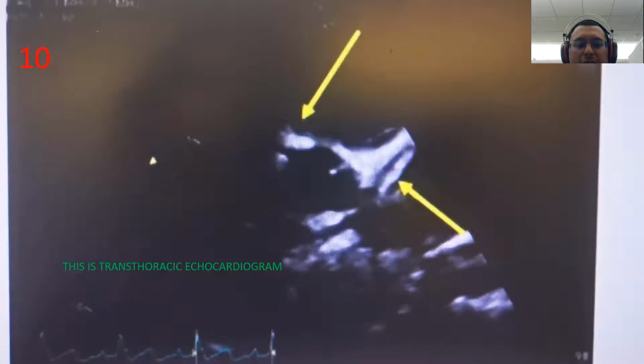Okay, so let's say you have a patient with a Mustard or Senning procedure. In order to calculate the pulmonary artery pressure, you have to calculate from whichever ventricle is connected to the pulmonary artery. If the left ventricle is connected to the pulmonary artery, you have to look at your jet not from the TR jet but from the MR jet. It's the other way around from routine. Yep, correct.